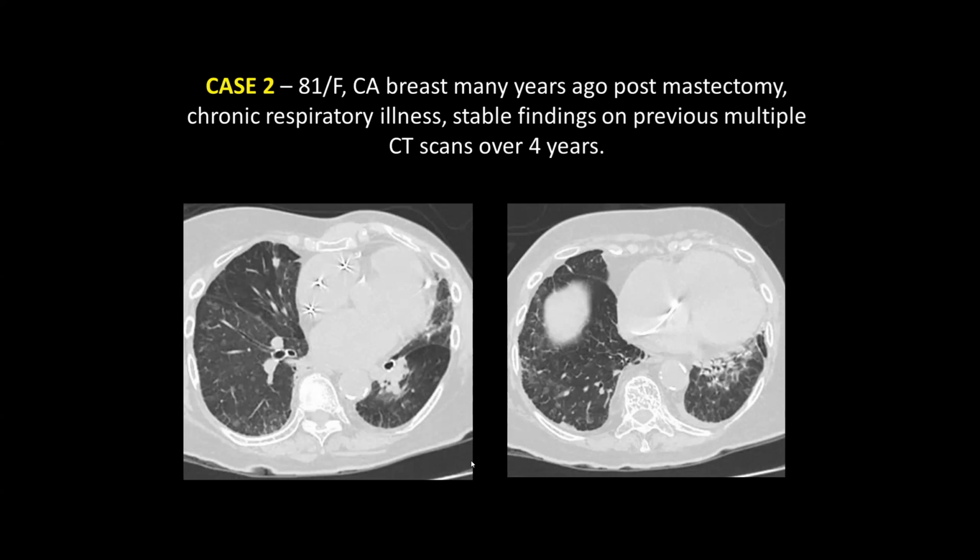Either it grows very rapidly, very fast, or if you develop a solid nodule within these ground glass areas, then it is worrisome. That is why in the lung cancer screening programs, you do follow these up for a very long time, because they are indolent also. I do not have histopathological proof for this, but I'm just doing a discussion and an approach based on what we have so far discussed.